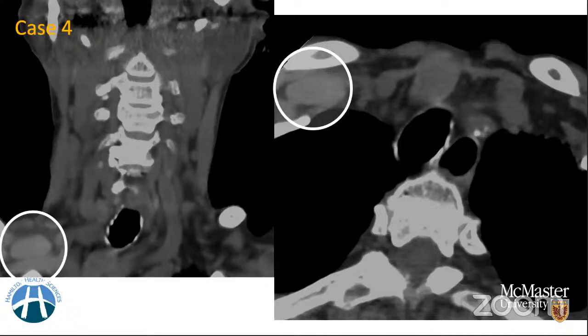When we were reviewing the history, it was found that this patient has a history of follicular lymphoma and has been in remission for the past 3 or 4 years without any imaging performed. The imaging before that did not show any supraclavicular lymphadenopathy, so this was new compared to about 4 years ago. Just looking at this finding, we recommended that this patient get a staging examination because this was a new lymph node. The patient presented to the emergency department, they performed all the blood work, and it looked like the patient was not doing well.